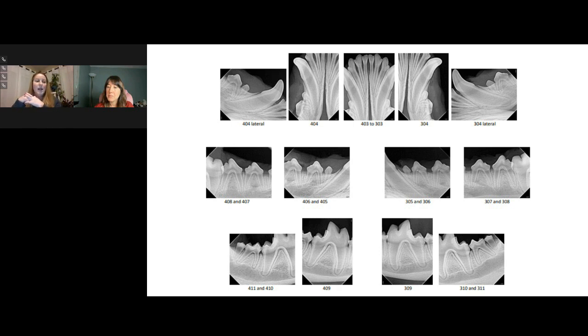With retained tooth roots, for instance in cats, I would get them out of there. It is super, super rare that a cat is going to have complete healing around a retained tooth root. I see them at least once a day in practice, retained tooth roots in cats that are causing problems. They cause problems. They just do. It's just the reality. Get them out.